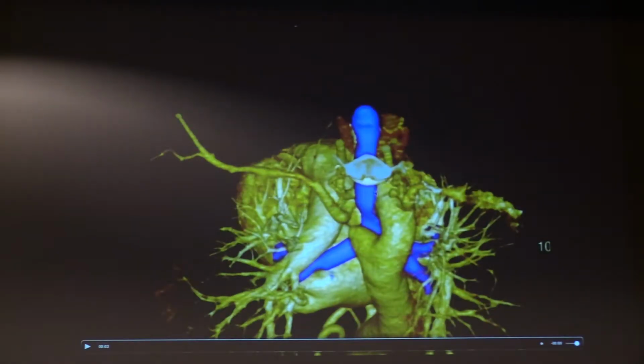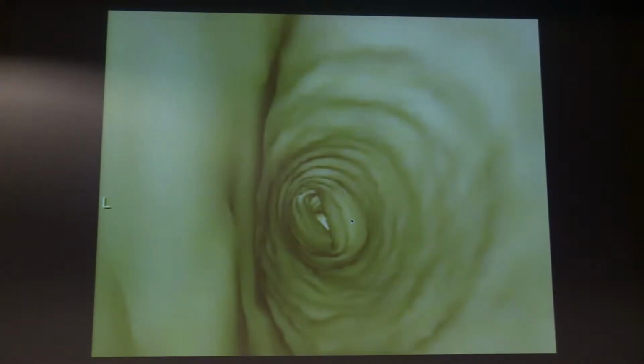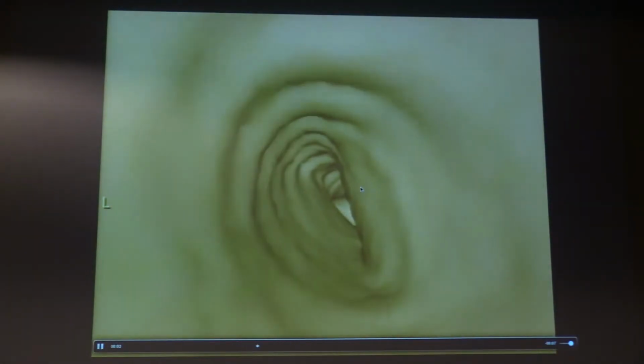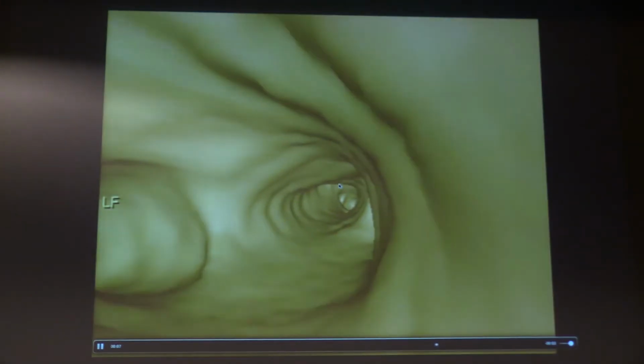You can see it quite well in the same place that the ring is crossing, so it makes a pressure on the trachea. We can do a virtual bronchoscopy. Here, this is the area that looks with pressure from the vascular ring. If we go inside, we actually see exactly the area where there is a pressure. And we're crossing this area and then it's totally patent.